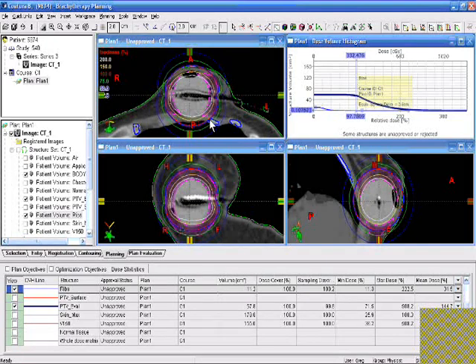Now if there was another actual bony rib in this region, or if there is a rib that is improperly calcified and not picked out, which could be here, it's possible that the dose we're calculating is artificially low. And we have optimized to balance the skin dose and the rib dose here. So you have to ask that question very carefully with the physician about what the balances are for those. But that's what we have for this case, and it looks pretty good a priori, but there is still that caveat.